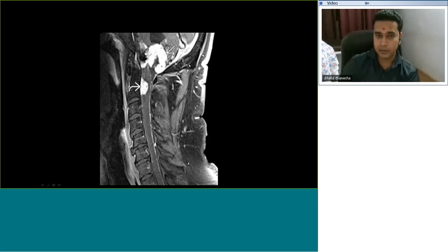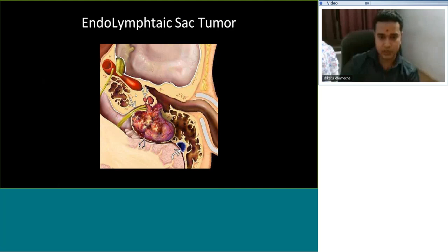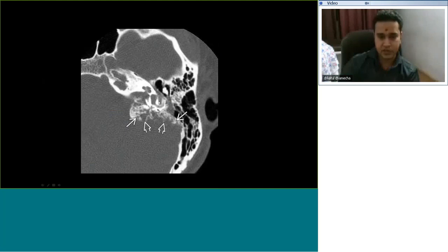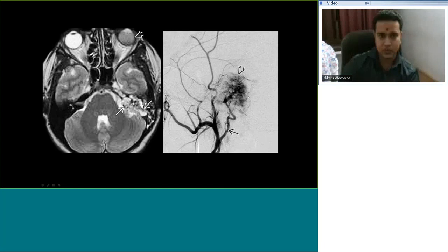Another thing is the endolymphatic sac tumor: significant destruction, significant enhancement on the MR, and significant vascularity.